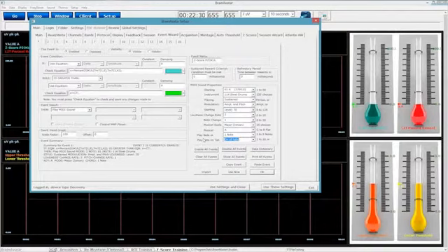When it comes down to picking out your MIDI sound properties, I try to remember the Casio keyboard that I had when I was 5 years old. It was a little tiny plastic keyboard that I loved hitting the demo button on and letting it play the music and pretending like I knew how to play an instrument. But there was a little bit more that came into it, and that is there is a sustained and there is a percussive method to it.